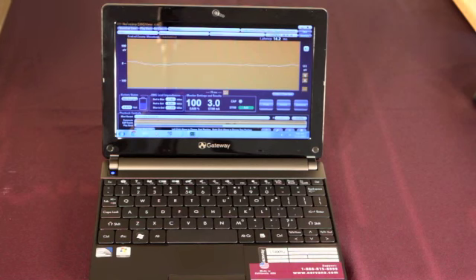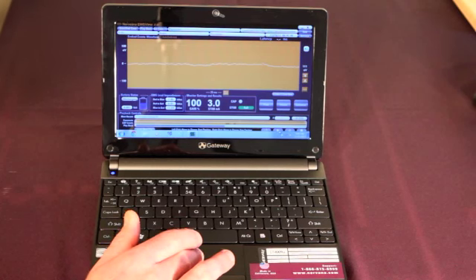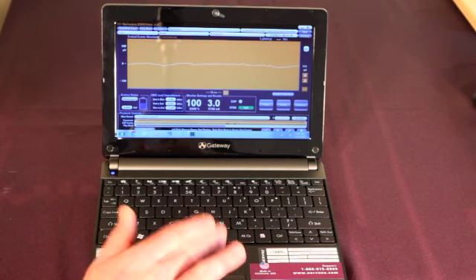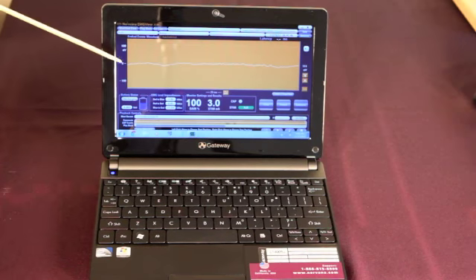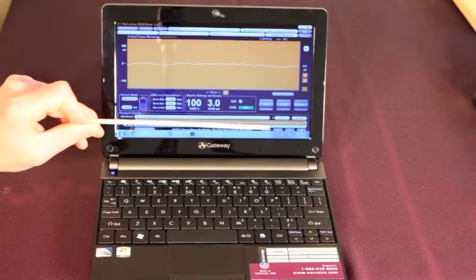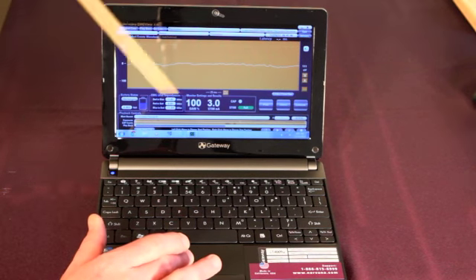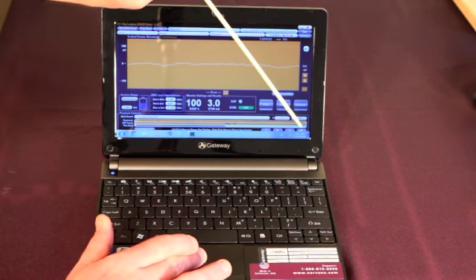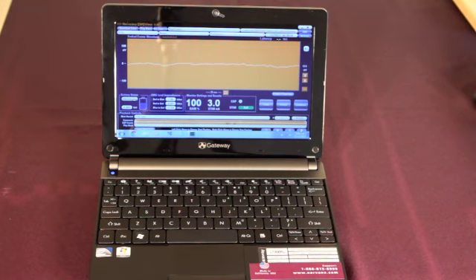And that brings me to the final point that I'd like to make, and that is you can jump to and view a particular point in the surgery through some controls that I'll share with you now. What I'm going to do first is pause my playback file, and you can see my blue bar has quit advancing and my screen isn't changing. The blue bar is still there. If I were to push play, it would continue to play from that point. But I'm going to do something different. I am going to click on the stop button in the far right, and you notice the blue bar disappeared.